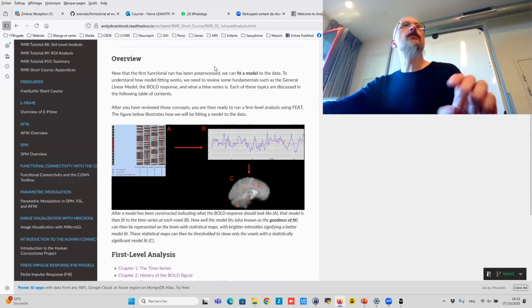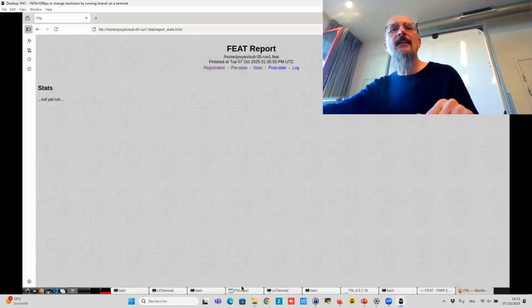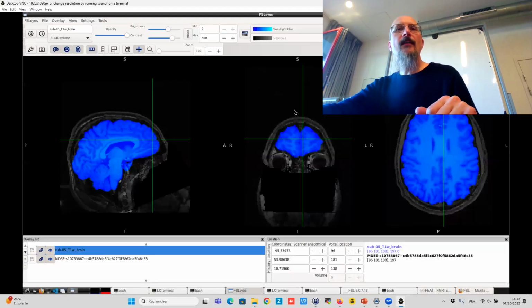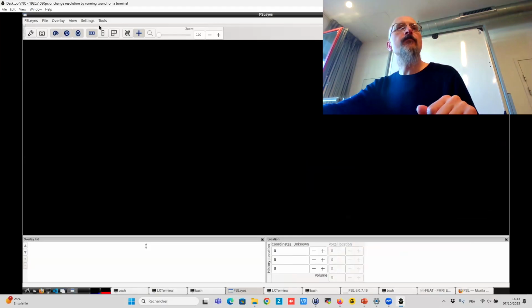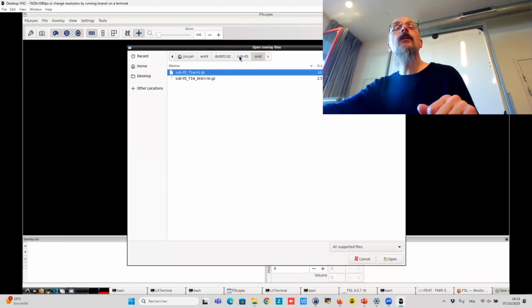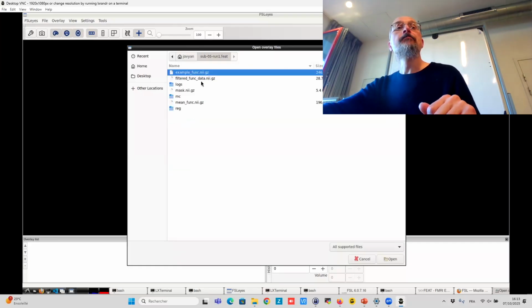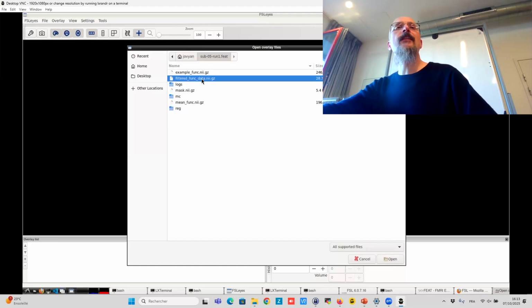Statistics. Let's go. Before that, let's look at what we got. Normally you should have FSLeyes somewhere. Let's get rid of that. If you go to File, Add from file, and we go to the subject, to your feat folder, which is here for me, you have filtered_func_data. This is your data after preprocessing.